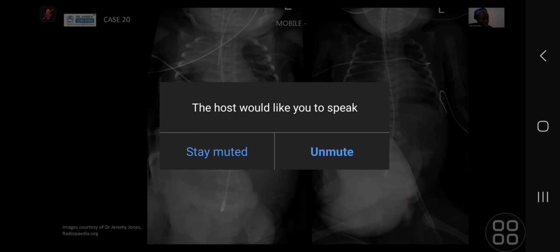Okay. What do you think it's going to? So what line would you expect to go down the midline from the pharynx, down the midline across the diaphragm? An EVD line, extraventricular drainage. No, just a common line we put in neonates. Yeah. So this is an NG tube? Yeah, NG tube. Within the stomach. Okay, so if it's in the stomach, this would be a very distended stomach.